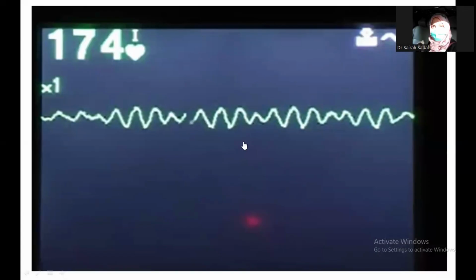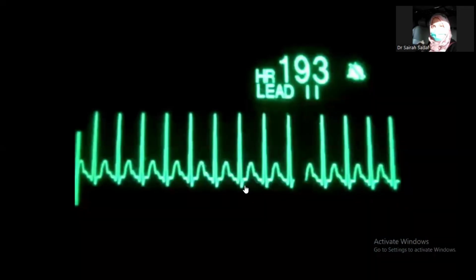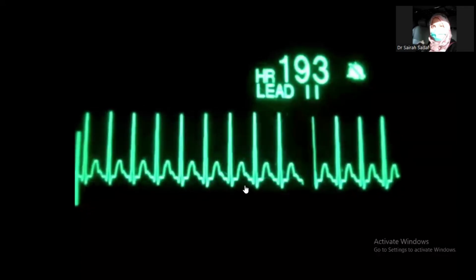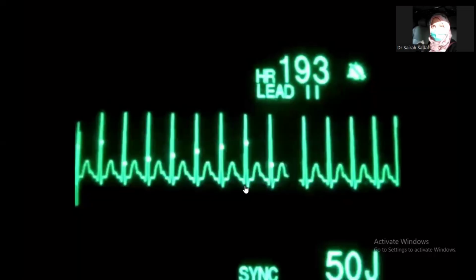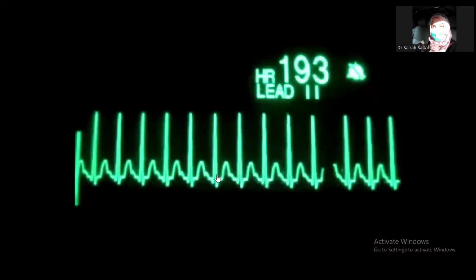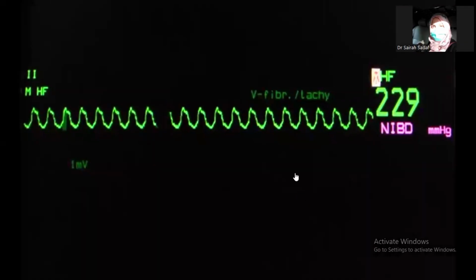Everyone, confirm VF. Okay, this one. This one played, thank goodness. Now this one. Okay, SVT. SVT. Solomon, Ahmed, right. SVT, Amna, SVT, Jennifer, SVT. Okay, good. Yes, Saima, SVT, very good. Let's move ahead. Now this one.